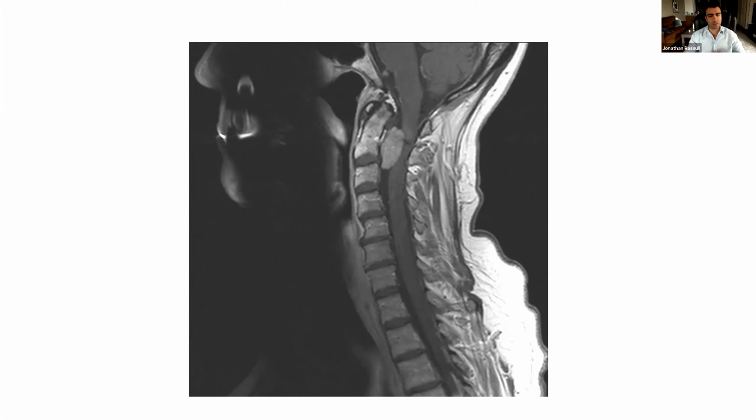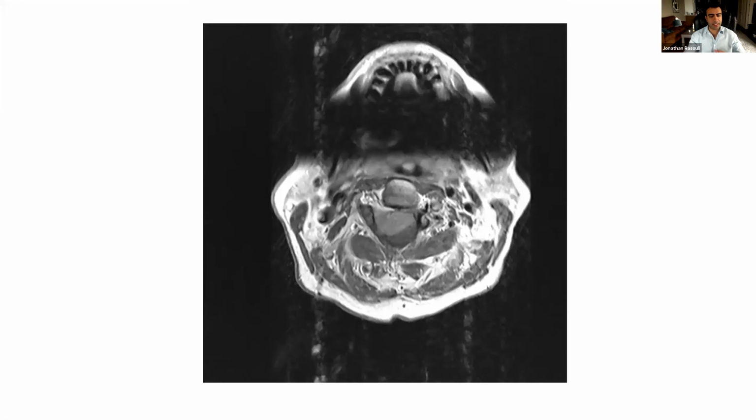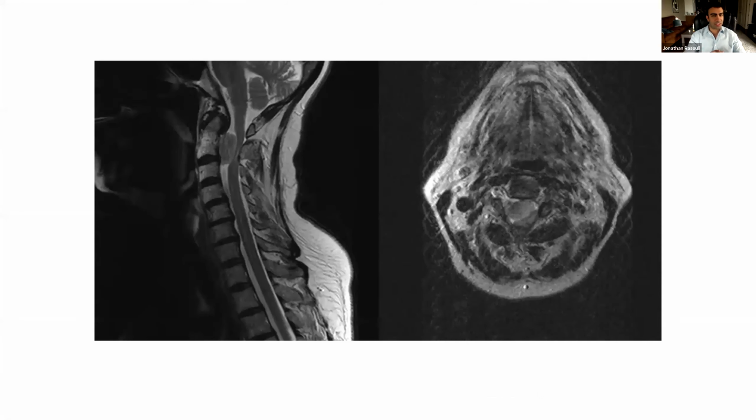And you see this spinal cord compression. There's maybe some evidence of spinal cord edema, and we can see on the axials that the spinal cord is posteriorly displaced. So presumably, if you take this patient for surgery, it's going to be right in your face the whole time. So one thing to keep in consideration.